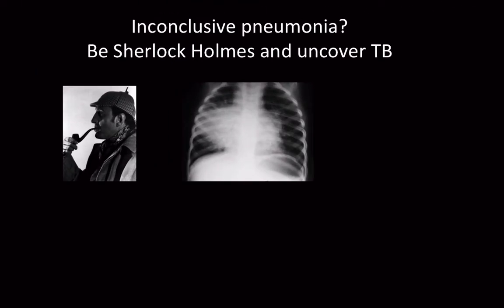So what I want you to do, this is the kind of last lesson of the day. You're looking for lymph nodes, you're looking for airway compression, and you've got to be Sherlock Holmes. So if you don't know who he is, he's a famous British investigator from Scotland Yard. So this is quite a difficult case I've put in front of you.